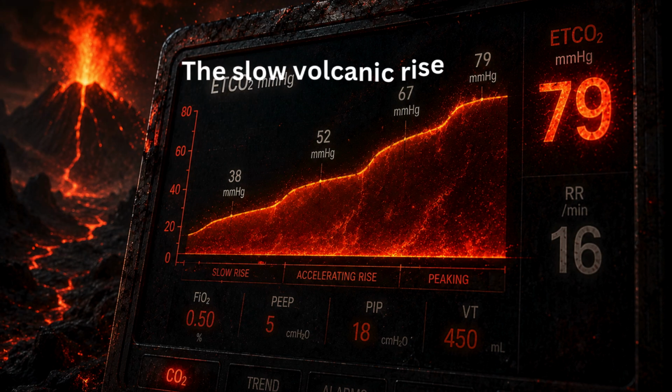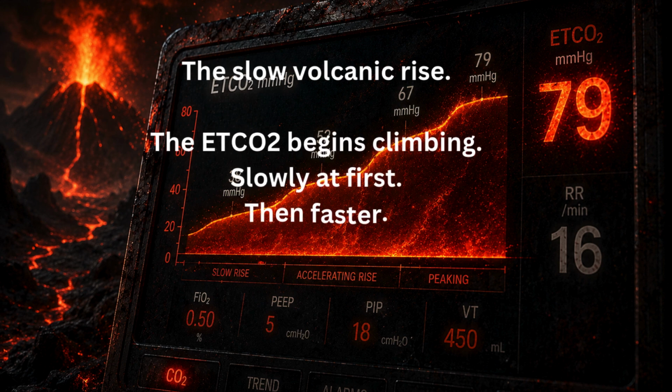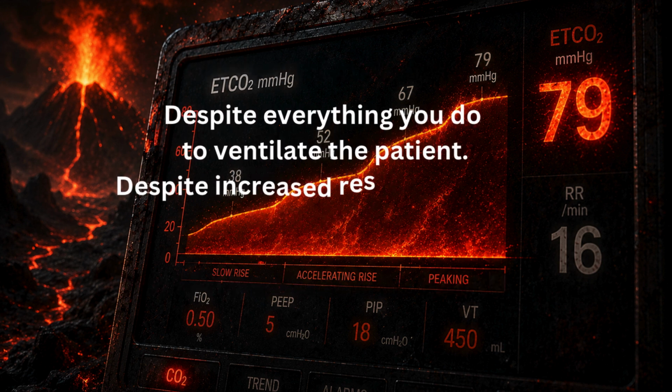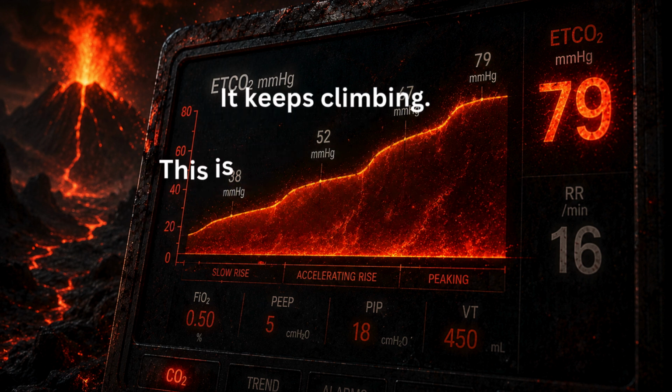The slow volcanic rise. The ETCO₂ begins climbing, slowly at first, then faster. Was 38, now 52, now 67, now 79. Despite everything you do to ventilate the patient, despite increased respiratory rate, despite increased tidal volume, it keeps climbing.